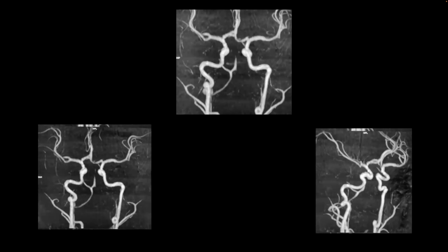Yeah, we don't have the source images, Dr. Lokesh, or the vessel wall images to check for inflammation. But there is a cutoff of the vertebral artery, so possibly thrombosis. Yeah, and a secondary change of infection-related vascular injury. But I would need more the source images or the vessel wall images to better evaluate that.